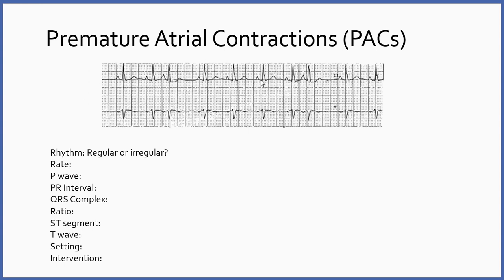But let's go back to the early beats. What happened there? I have a sinus rhythm, but what happened? If you look at this early beat, remember, we're going to start with the beat before, where we identified a P wave, a QRS, and then there should have been a T wave here. If this is early, there should have been a P wave here, QRS, T wave. So that one beat, I can't see the T wave from the previous beat, and I can't see the P wave from the early beat. What do you think happened?